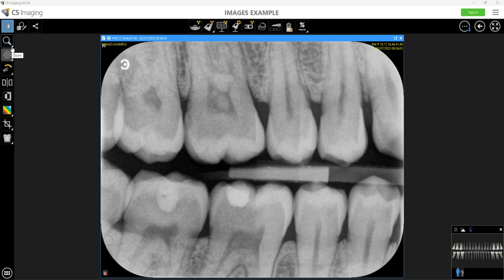Please note in the bottom right hand corner there is a white icon on some of these tabs. By clicking on that then opens up an additional section of settings. This follows throughout CSi8, so whether you see a white arrow in the bottom corner, this allows additional settings.